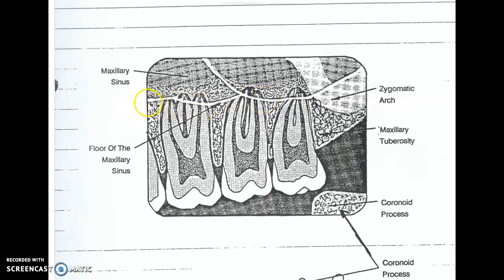to your molars. So you'll see this fine, very delicate, almost lacy-like radiopaque line. That is either the floor of, or the septum, or the wall of the maxillary sinus. So make sure when you're reading a question, if it's a verbal question, is it asking you for the floor or septum or wall? Because that particular item is going to be radiopaque. Or is it asking you for the body of the maxillary sinus? The body of the maxillary sinus is the actual space, so it's going to be radiolucent.